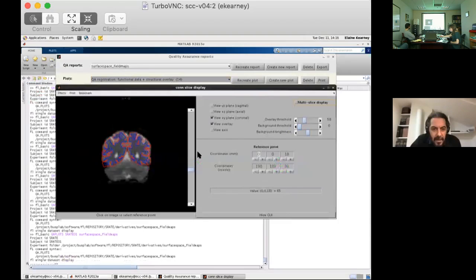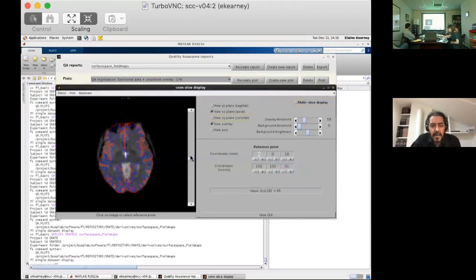So this is S303. Okay, Jason, if you don't mind, show what you were saying here. Yeah, I see those anterior parts that have huge signal dropout, right? And this is supposed to be after the fieldmap correction. So this is the mouse.